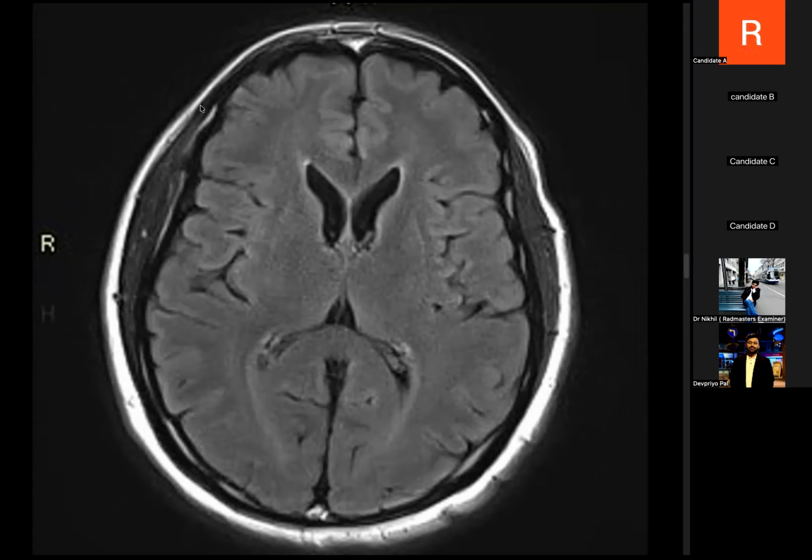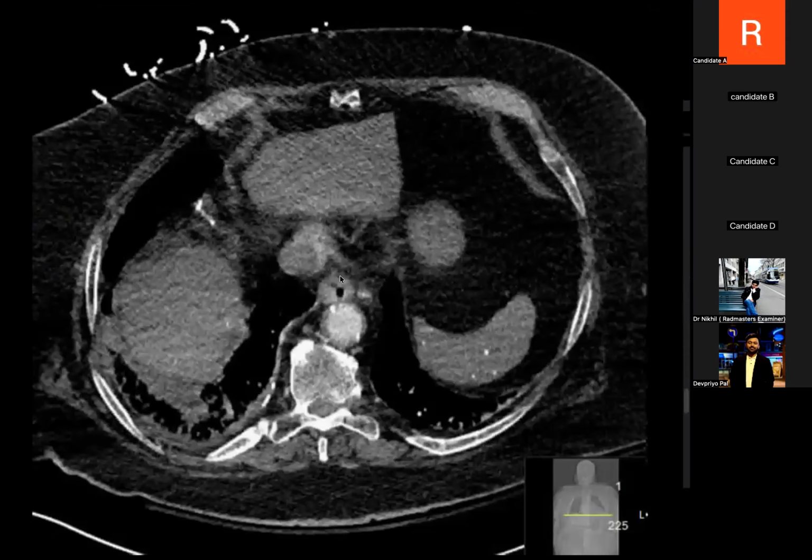Okay. So please read about neurodegenerative diseases. PET imaging is a very favorite among the FRCR exams. And also Alzheimer's and all these kinds of neurodegenerative diseases can come up in exams. So be prepared for that. Okay. This case was a case of asbestosis with lung malignancy. One small piece of advice, please look at the margins of the x-rays.